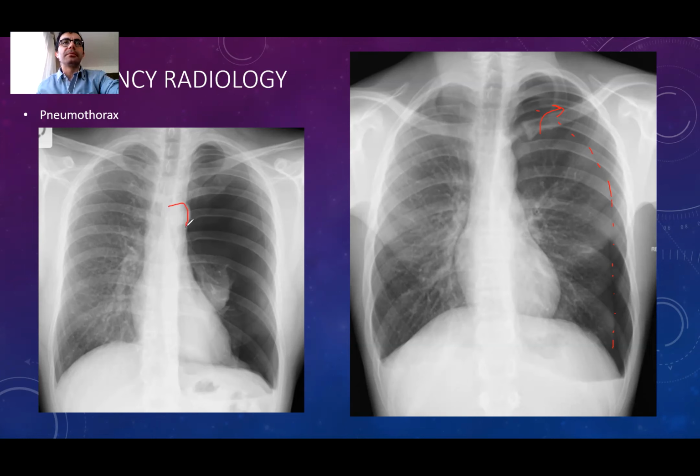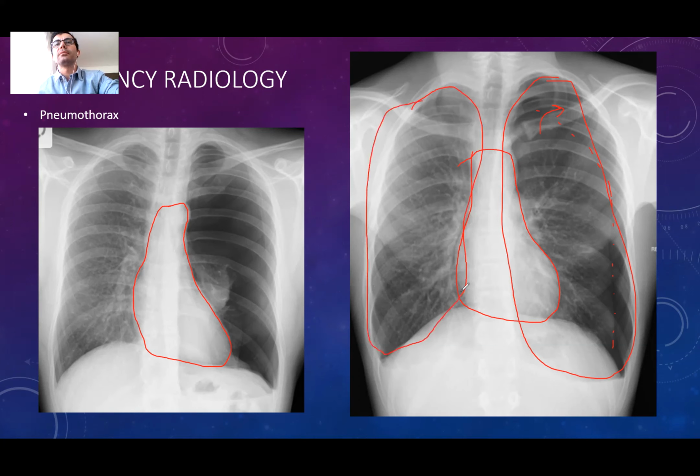When I see the lung, I assume nobody has an idea, right? Okay, I see the heart is right here, but when I look at this, the heart has gone to the mid-thorax actually, and the air volume of the left hemithorax is significantly larger than the right hemithorax. So the air density, the volume is much higher in here than here. So when I compare, I can easily see which is the case here, but it is not as severe.